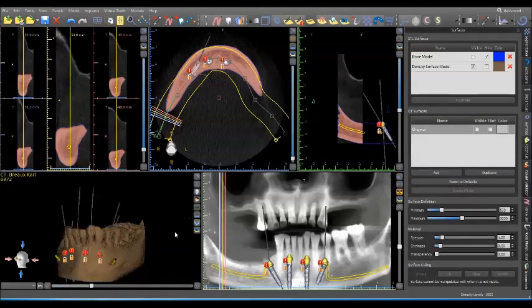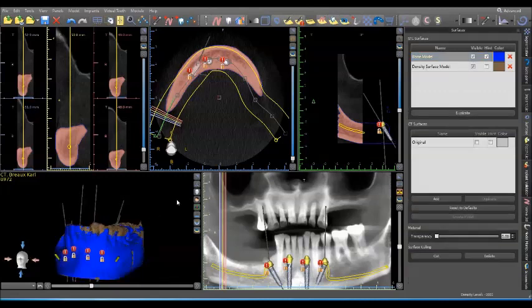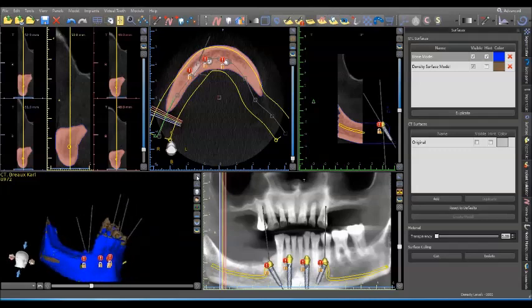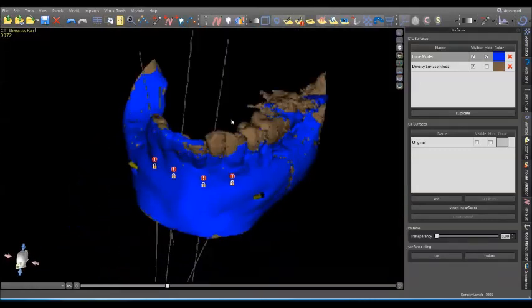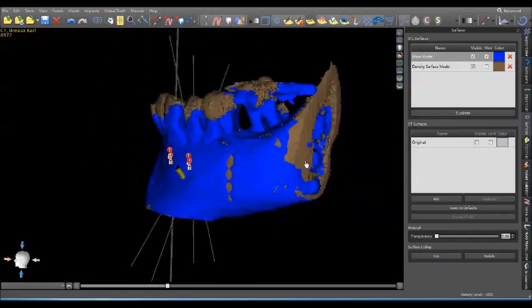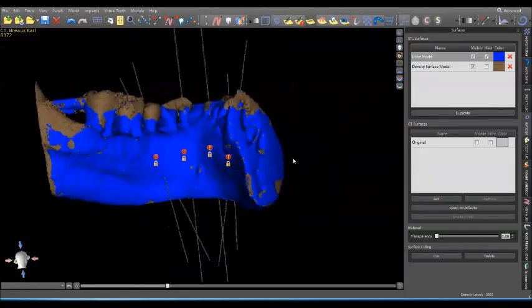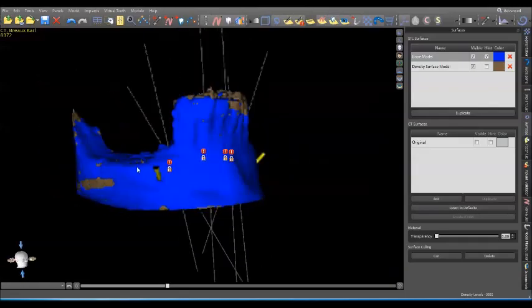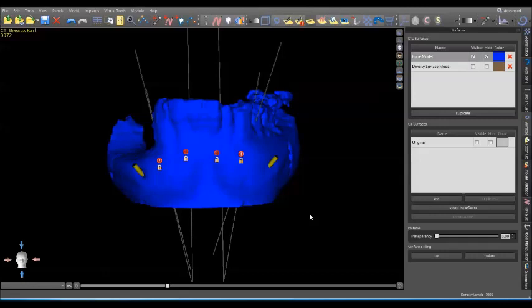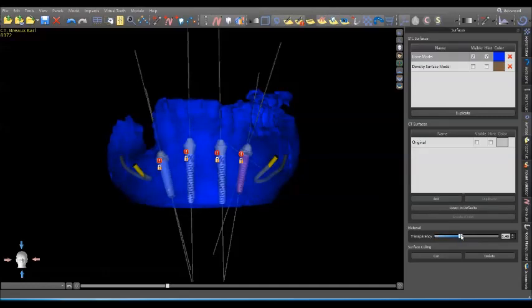So now we have this density model, and we also have this bone model. You can see the difference between them. I'll probably still use the bone model and not the density model. They're both pretty good. I'd be happy with using both of them. This is easy to do in the mandible. This is a whole different ball game to do in the maxilla. I definitely recommend outsourcing this project in the maxilla. It is not worth your time and effort to try to figure this all out.